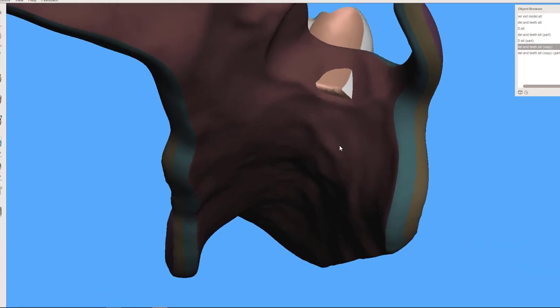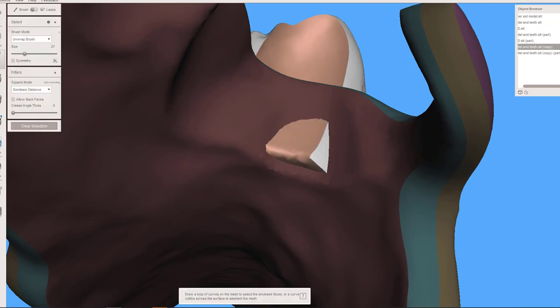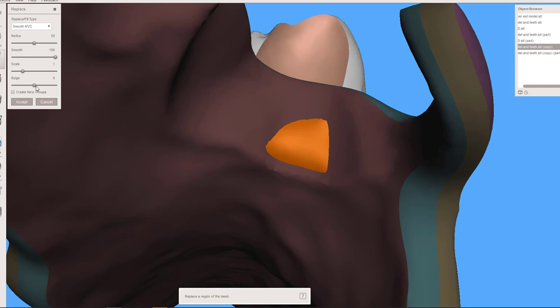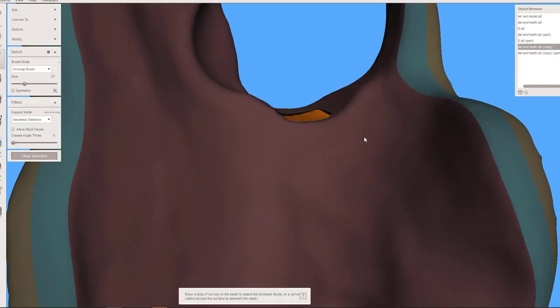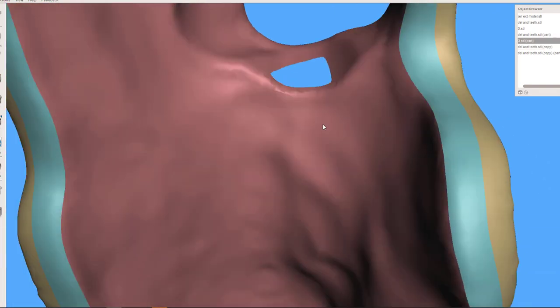All right. Only thing I'm not loving is that. So I'm going to fix that. This is a bonus for you. So I'm going to take that. I'm just selecting that part, F for erase and fill, and I'm going to drag this bulge slider back and make that where it's somewhat concave. Okay. And then the base, I want to get rid of that perforation through it.